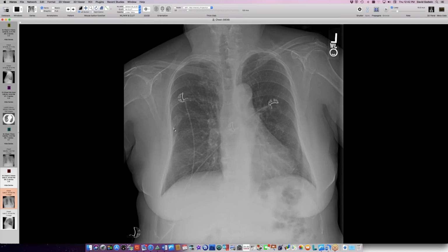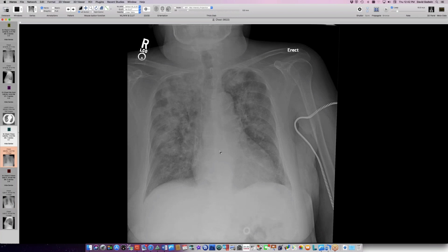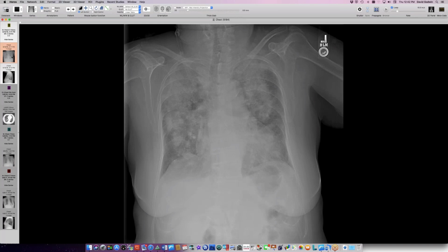So here's another person. This is a radiograph from last year, 2017, before this person became symptomatic. And things weren't going so well this year. This person presented with this patchy consolidation and a lot of respiratory distress, with worsening over several days. So here's our last radiograph on this person with even denser, cloud-like stuff in both upper lungs.